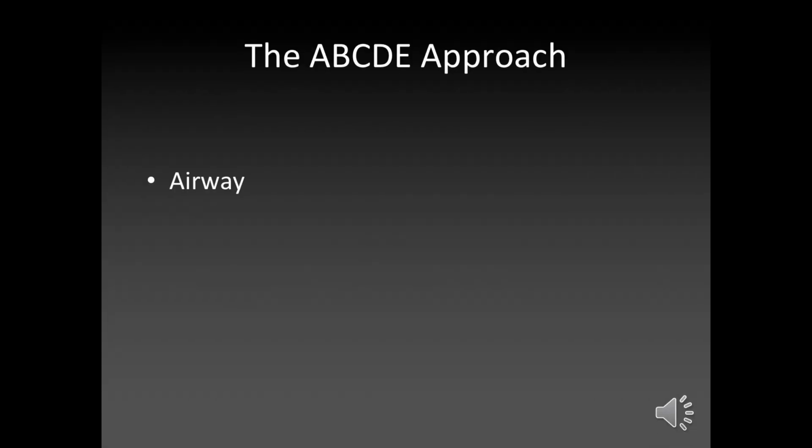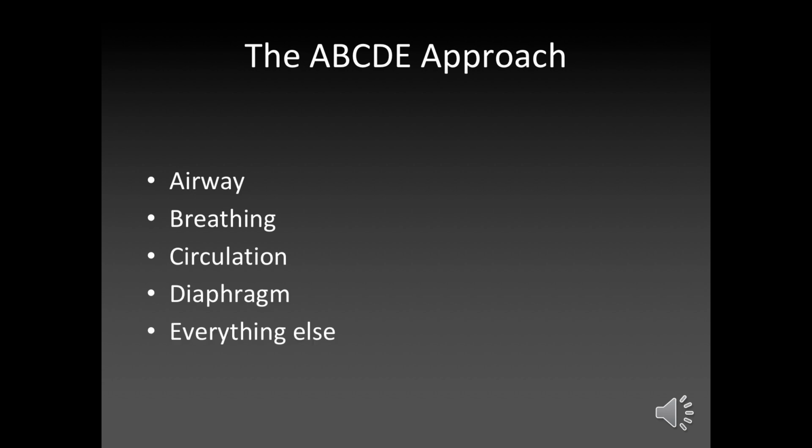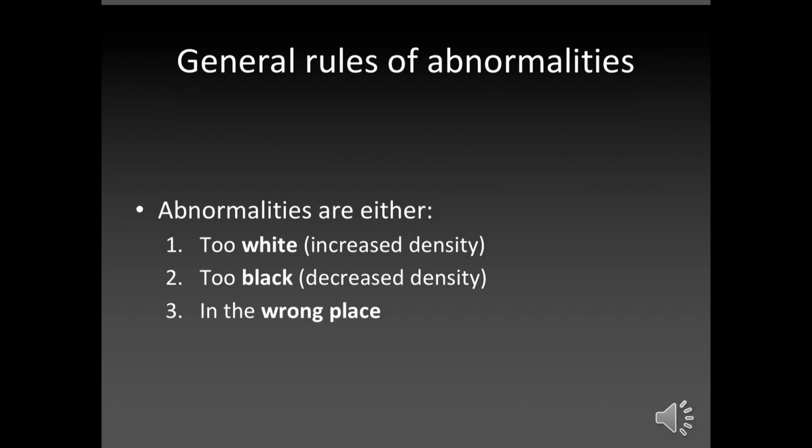So ABCD: airway, breathing, circulation, diaphragm, and everything else. Everything else, there's not actually too much to it.